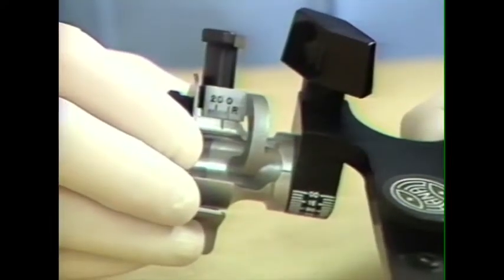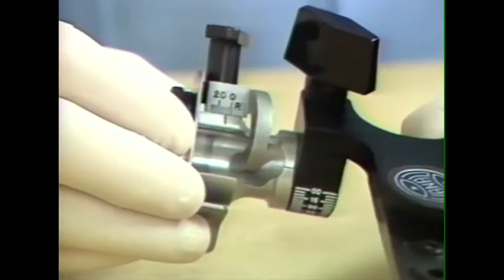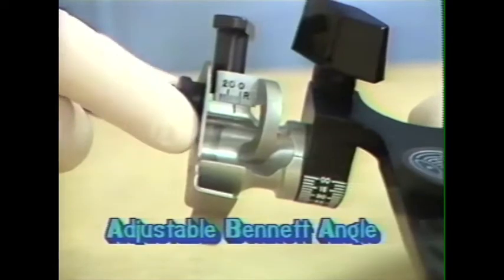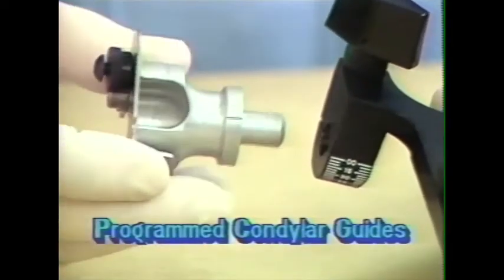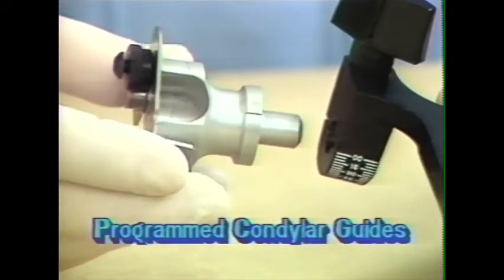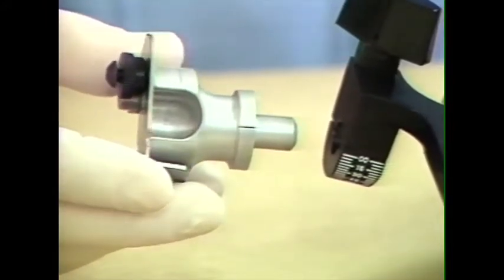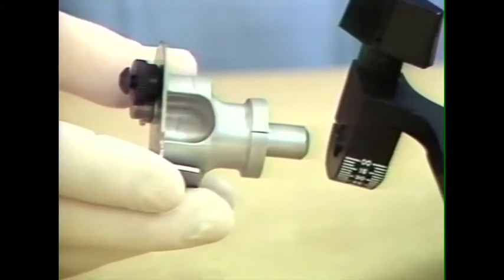There are 4 types of fossa elements available for the modular articulator. The one that we have illustrated before is the one with the adjustable Bennett angle. The second type that is available is the programmed fossa, in which a certain degree of Bennett immediate side shift has been programmed into the fossa element. There are various choices of curvatures and immediate side shifts available with this element.